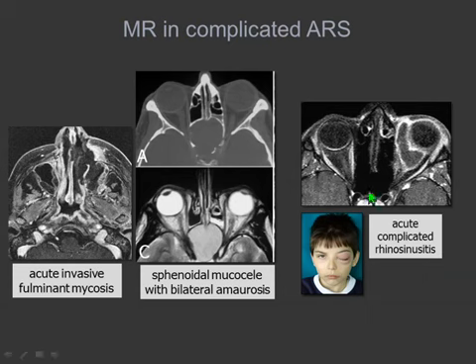One is the pediatric patient. In this pediatric patient, there is not only the spread in the anterior compartment, as you can easily see from the picture, but also an abscess that can be very precisely delineated by the MRI after contrast agent injection. Fluid and rim enhancement suggest the collection of fluid, something that can be drained.